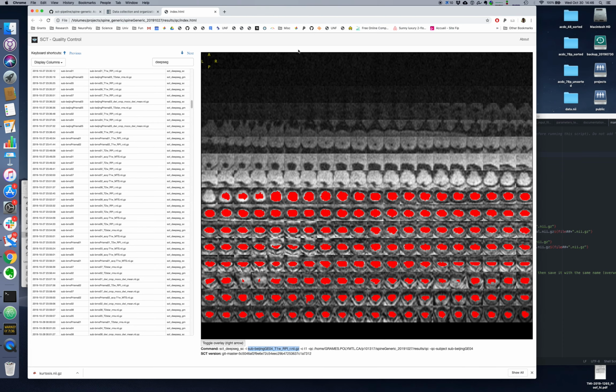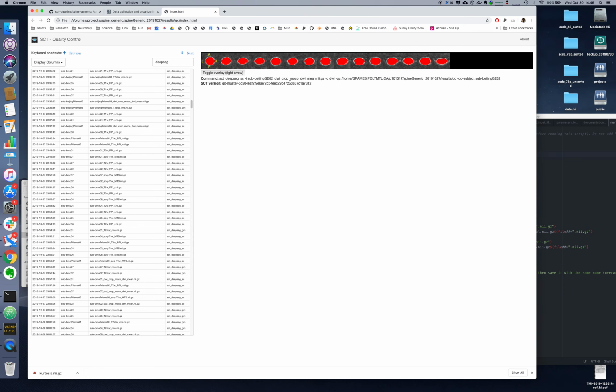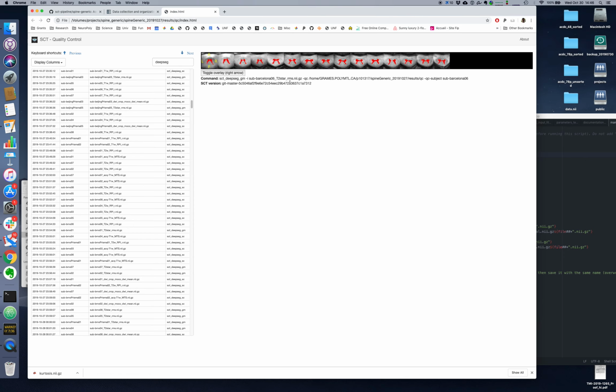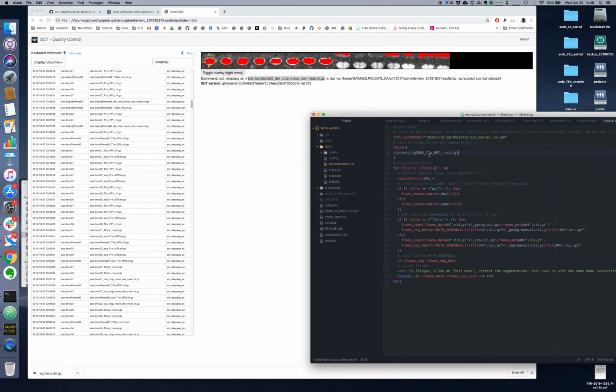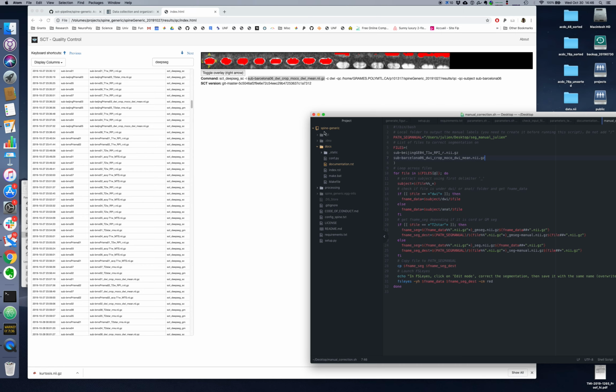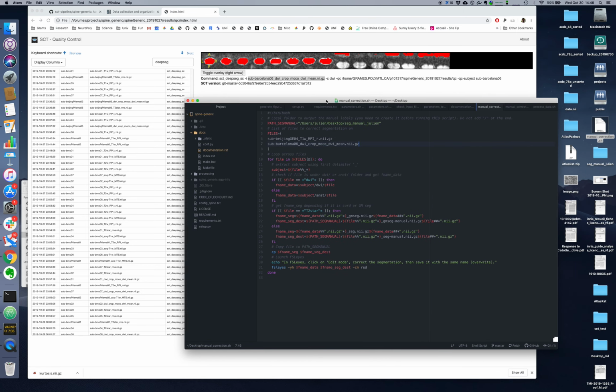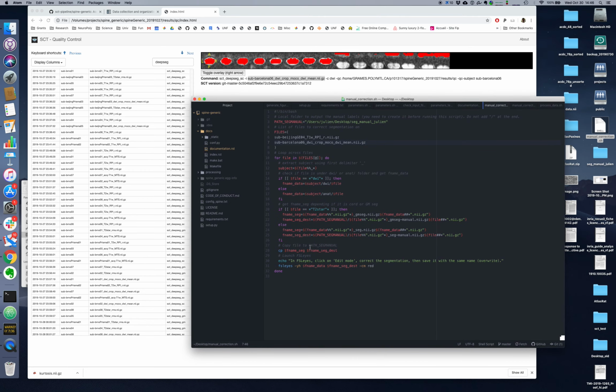Okay, going back to the report, looking for all the subjects. Okay, this is also clearly wrong. So I'm copying this one and adding it here. So now we have two subjects, so I can show you how we're going to run this script and loop through all the subjects for manual correction.